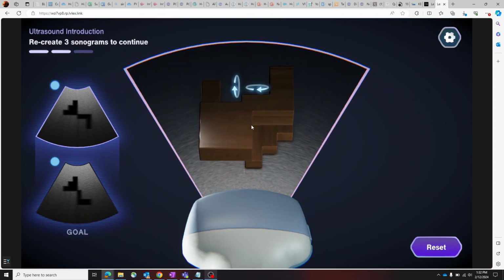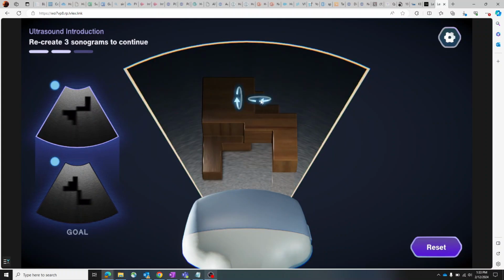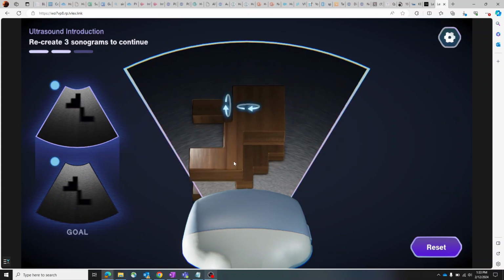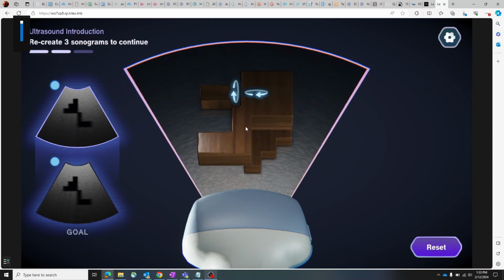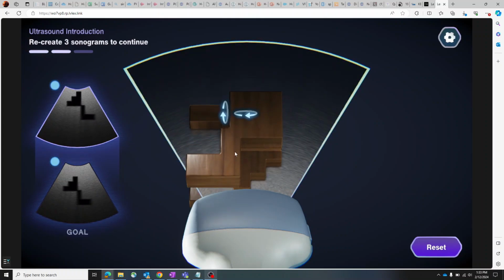Okay, for this next section, we wanted to move towards more of a human object that you're scanning over. So we designed this sort of crash test dummy, which we've embedded these different objects within. And these objects are a lot more organic looking. They're no longer just common items you might see. So you really have to take a hard look at them and identify, okay, what's unique about this object? What am I looking for? Because they may be very similar depending on the angle that you're viewing it at.